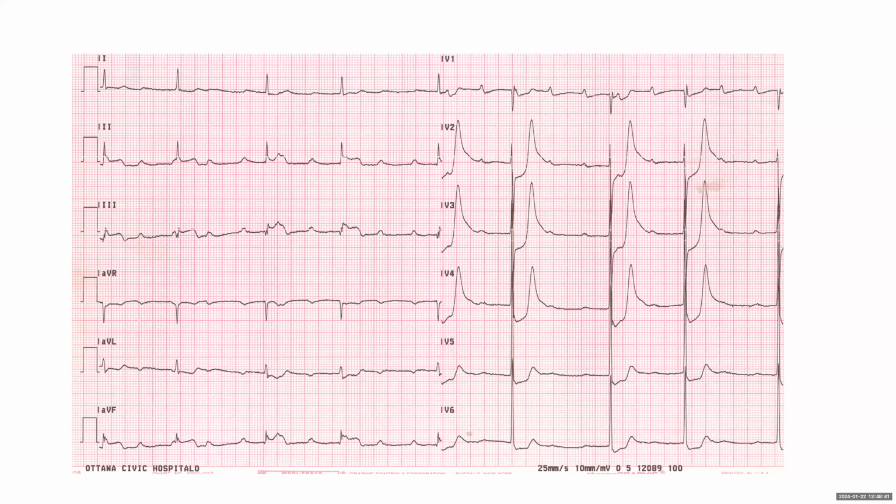But when you have a long strip, the pattern shouldn't be group beating. Ventriculophasic, yeah, the P interval where the QRS is in the middle can be a bit shorter than the other one, but usually it's fairly regular. So the difference is not huge.